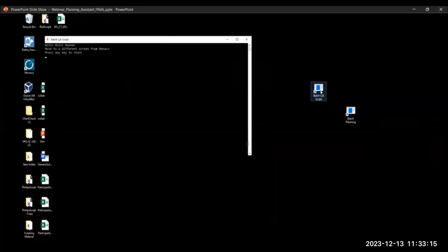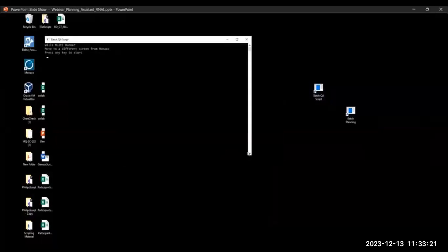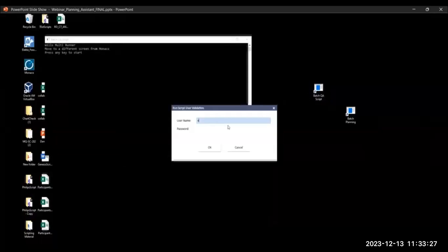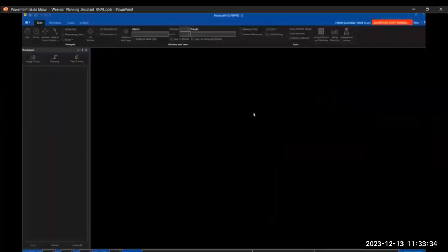Okay. You can also do batch QA planning. So here is another script that we have that just takes a list of patients and automatically creates those QA plans for you. So again, rather than sitting and creating all the QA plans, and really for those who are routinely doing plan QA, it can really be like watching paint dry, if I'm honest. So having a task that's able to automate that process for you can really speed things up.